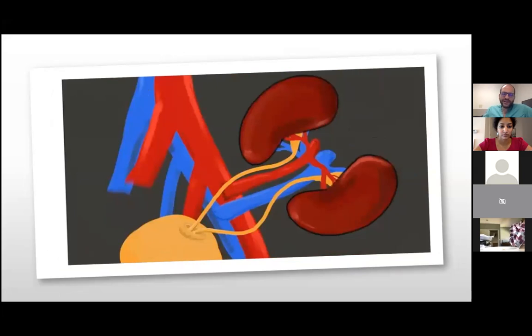And then finally, you can get all kinds of weird kidney transplants. This is something we do quite commonly here at UC Davis. This is a pediatric en bloc kidney transplant, where the pediatric kidneys get so small that eventually you just have to take the whole donor aorta and donor inferior vena cava and take the two really small kidneys that end up being just a few centimeters in size and then transplant them in there. And interestingly, they can grow quite rapidly into normal size kidney transplants.